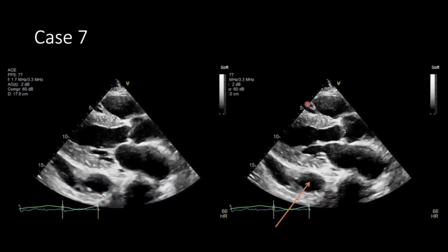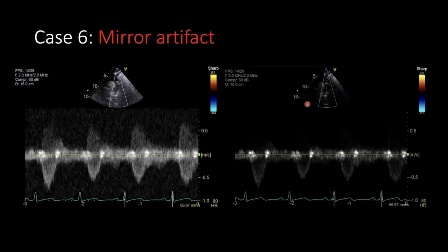Is it CW? It would be true and bad because sometimes it can cut one of the branches. Right, it's a CW. He's just mentioning here that if it's a CW, you want to double check where the wave is projecting, because it could be a sign that it's going into one of the side branches. So it could be a real finding.